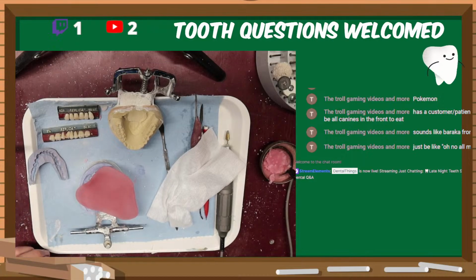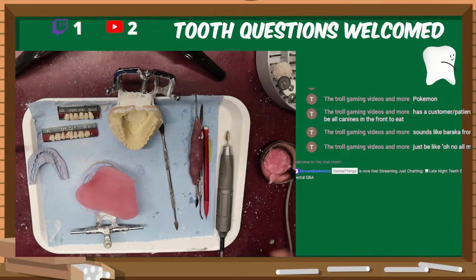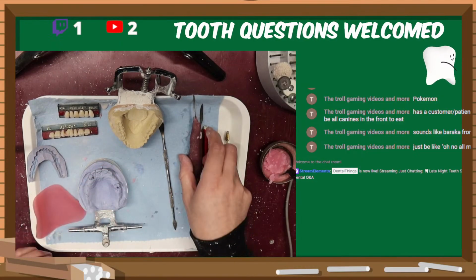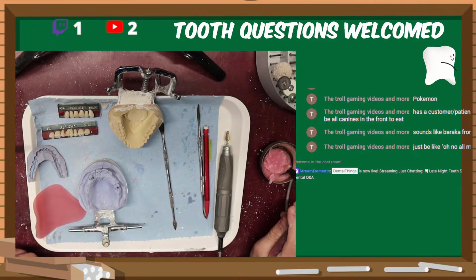Alright, so I need this. I want, we'll use this one. Alright, so let's go and do this. Let's get this nice and heated up.